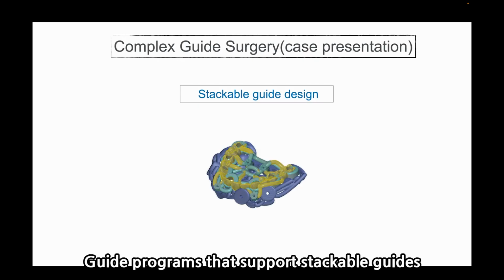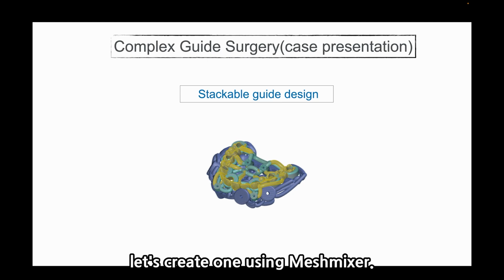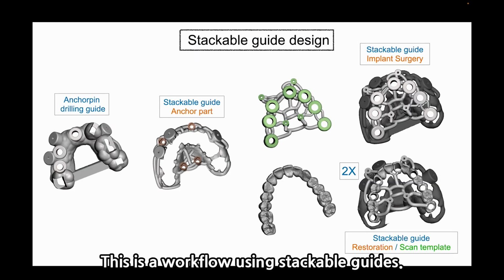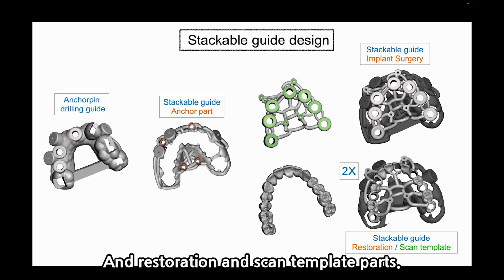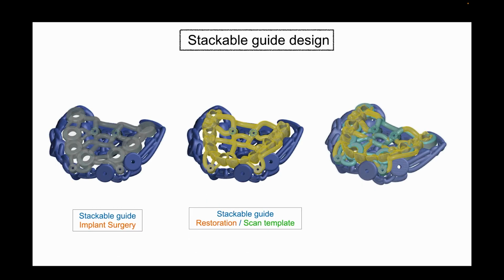A guide program that supports stackable guides can be used, but for simplicity, let's create one using Meshmixer. This is a workflow using a stackable guide, anchor pin drilling guide, implant surgery guide, and restoration and scan template part. Combining them looks like this.